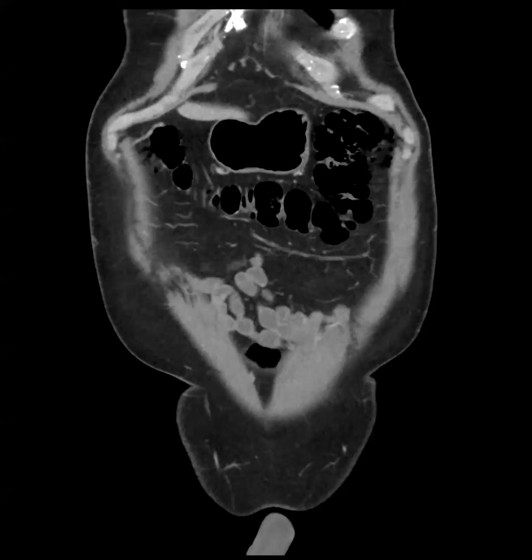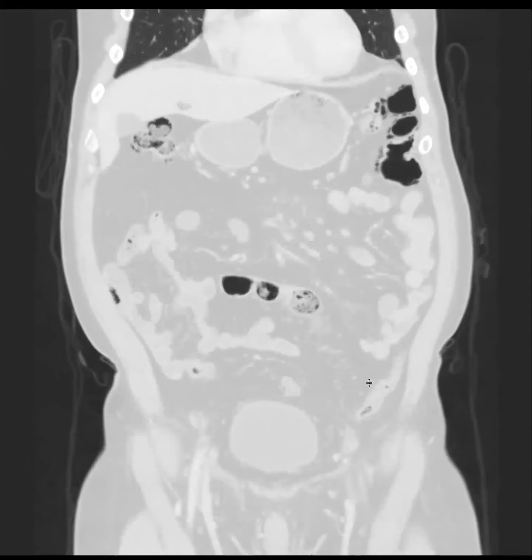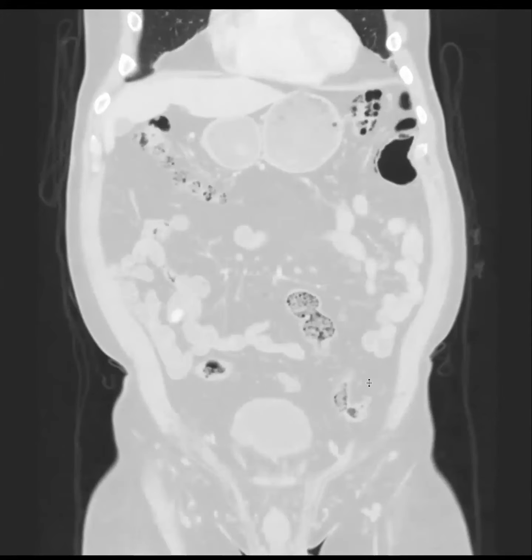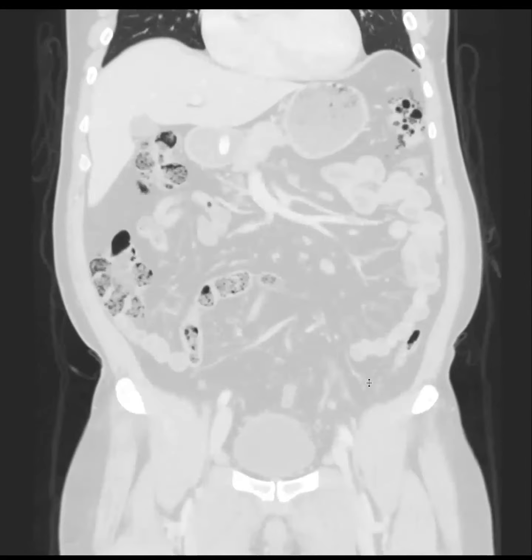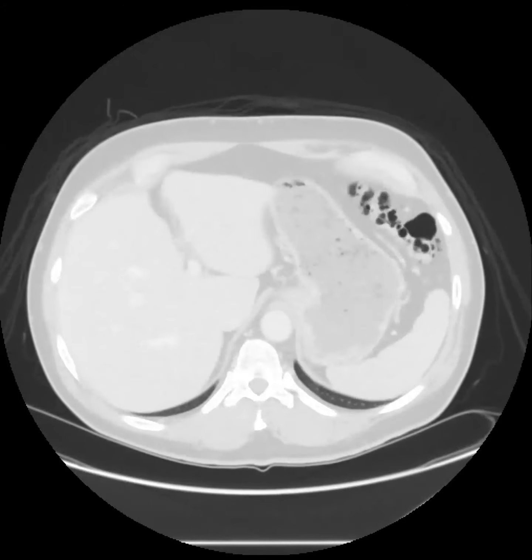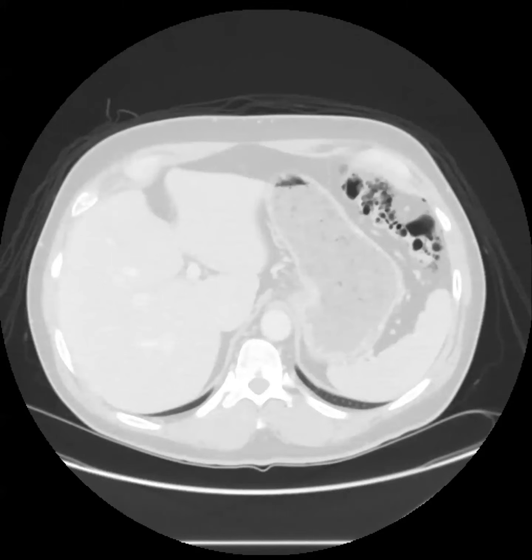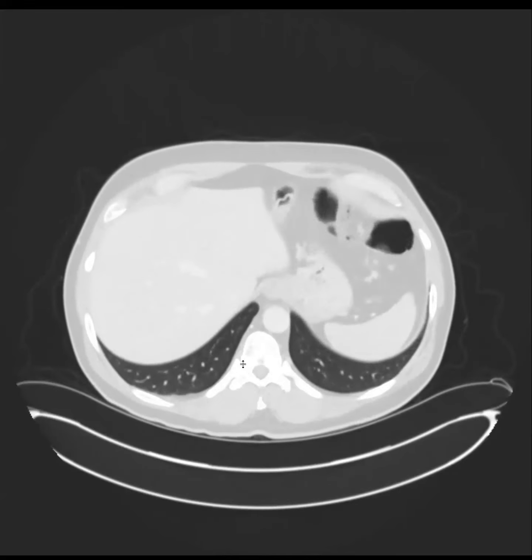This is a patient with stable findings in the bowel wall. I see pneumatosis, but almost bubbly pneumatosis. Yes, like pneumatosis cystoides. Yep, exactly. So I will tell you, we have 2 studies that are 2 years apart. This was the study from 2 years earlier.